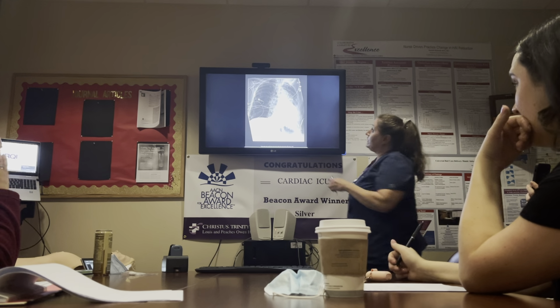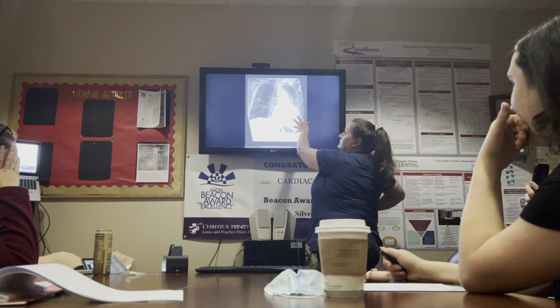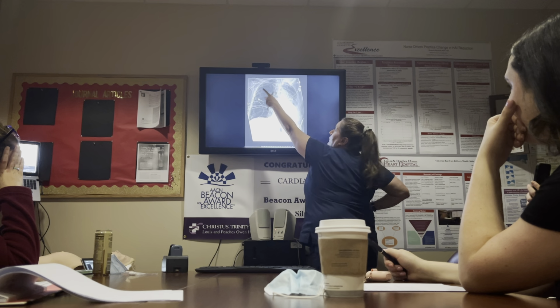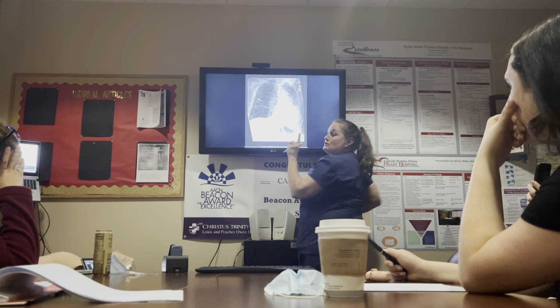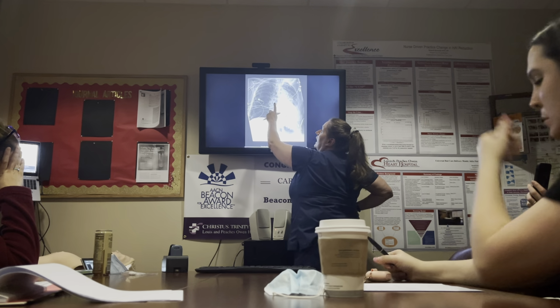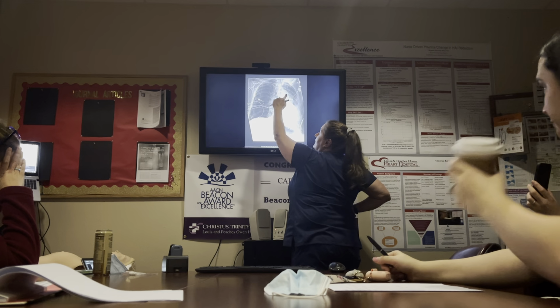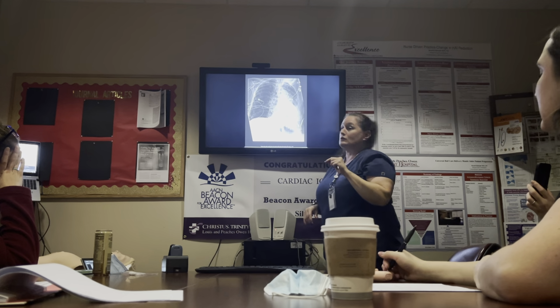Okay, so with this, again, you see the shift, okay? So the heart silhouette's over here. That lower lung is compressed. This is the feeding tube. They've got an airway. They've got a central line, so they've got a subclavian central line. And the reason that I know that is you can see the ports sitting off here, okay, versus the PICC line, which you're not really going to see the ports unless you get that arm in there. Calcified aortic knob there. But yeah, this is a malposition of the feeding tube, okay?